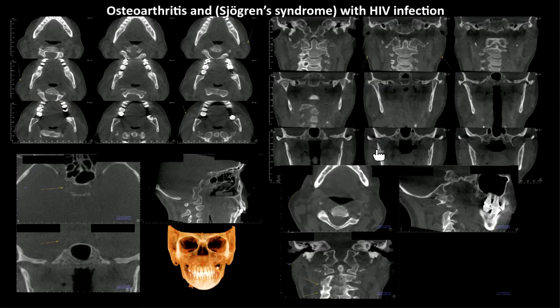And for the same patient, it was very interesting. The patient revealed that the patient is HIV infected. And also, when I'm looking at the scan, I saw a lot of opacification, or we call it a hyperdense area, in the CBCT. I can see a lot of hyperdensity in the parotid gland region. So the patient has reduced saliva, and the patient also has Sjögren syndrome in this case. And we also found not just degenerative joint disease, but also osteoarthritis in that area too. So over time, you can see a lot.